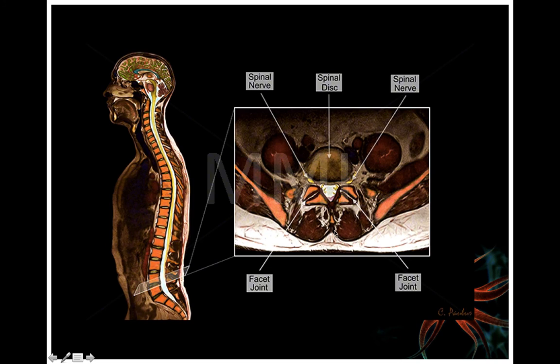What is this? Spinous process. This is the transverse process. You're catching the bone a little bit. Now this is color, but you're not going to see color on regular MRI. The important structures are what? This is either the vertebral body or the disc, right? So if you keep going up, you'll see bone and then disc, bone, disc, because we're moving the slices up, right? But since we're seeing the foramen on the side, this is the disc.